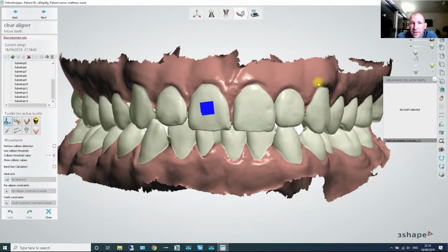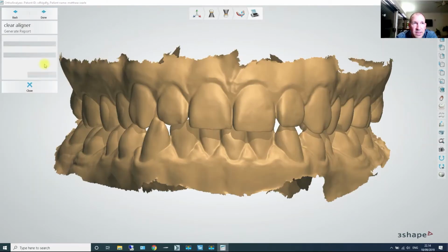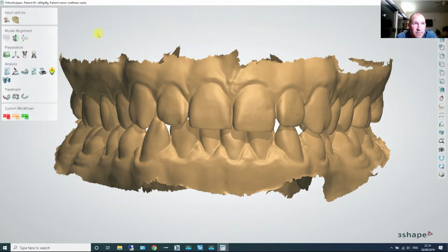Okay, so now that they've finished saving, we can go next. It'll generate a report for us, and we can save session, or we can go done. So just up here, just so you know, that's where you merge the cone beam as well. So we'll close out here. The file has been modified. Do you want to save the changes? Let's go yes.